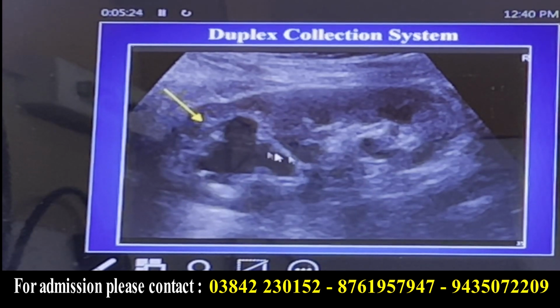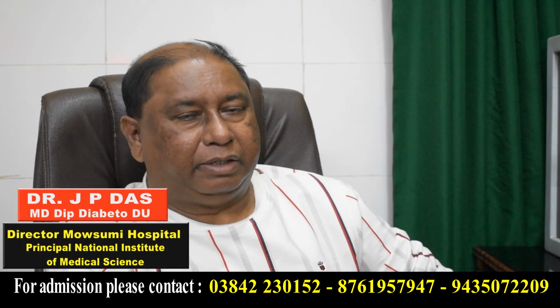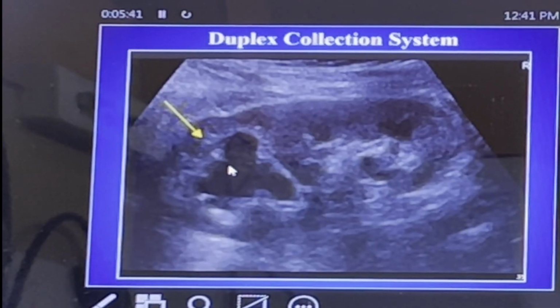What you see in this picture is a duplex collecting system. The degree of duplication generally varies from person to person. It may range from duplication only in the renal pelvis to complete duplication of the ureter.